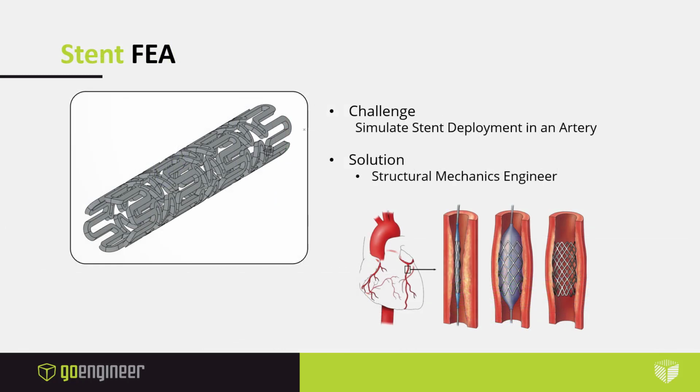All right, for the next example, it's a very popular case study in the life sciences field, which is coronary angioplasty. You're essentially simulating the deployment of a stent in an artery, and we'll be taking advantage of the structural mechanics engineer role, which is the Abaqus solver on the 3DEXPERIENCE platform.